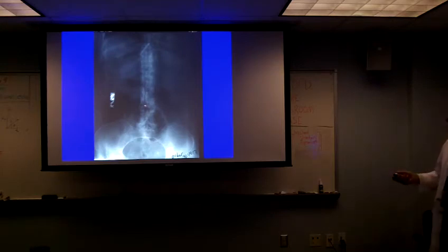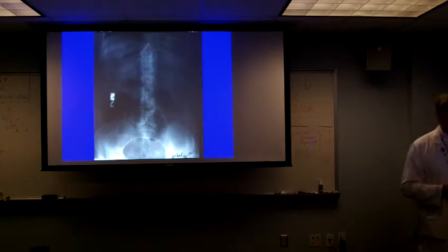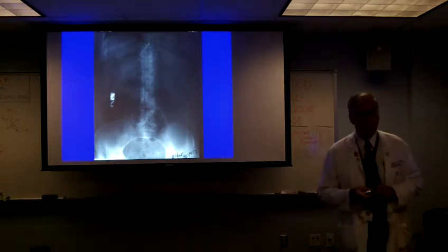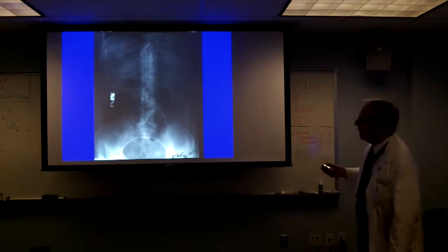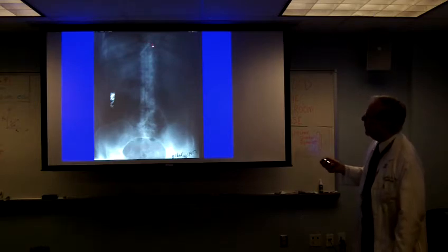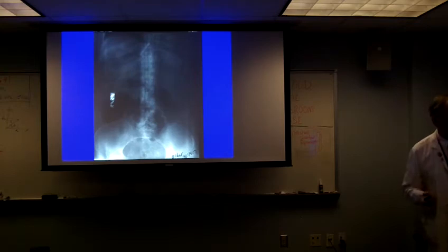If you've not seen one before, this is a Venatech IVC filter, but I'm showing you the film for this. This is the radiopaque tip on a Corpak feeding tube. What do you think about that? Is that appropriately positioned? No, sir. What's wrong with it? It's going to the right mainstem bronchus. Well, no, we're in the abdomen here. This is liver here. Oh, sorry, it looked dark. Yeah, well, it is. The whole film is dark.